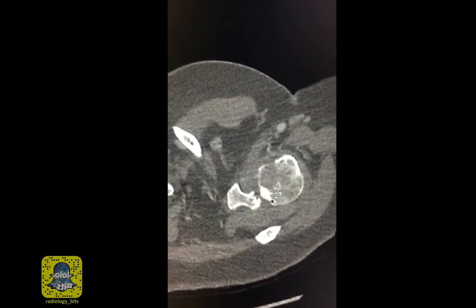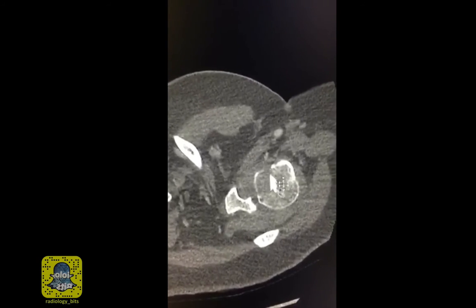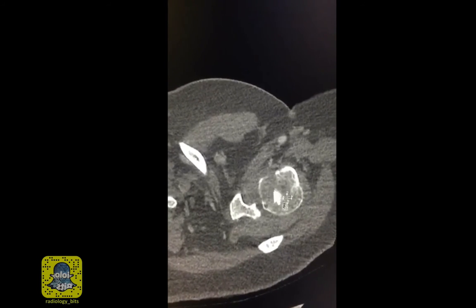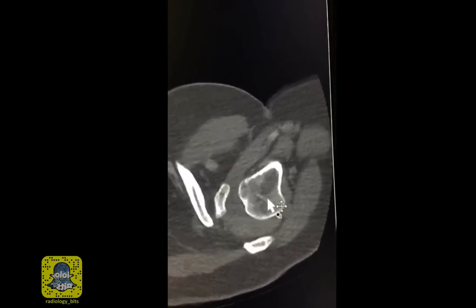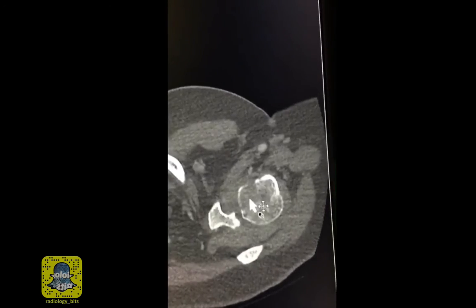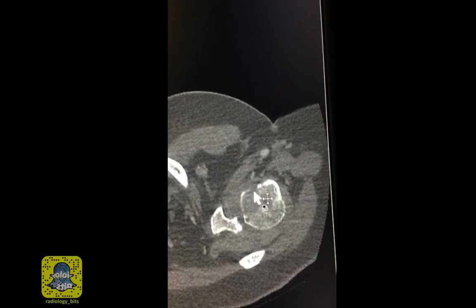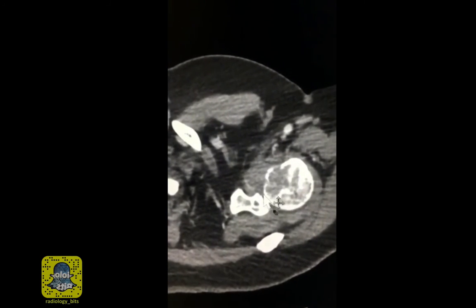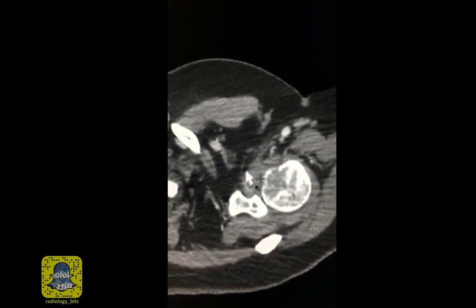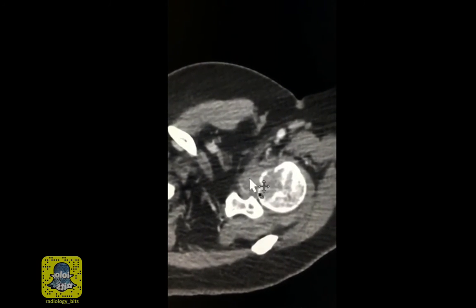Let's not forget to look at the bones on the CT chest, and here you see the lesion that was clearly detected on the MRI. There's a very heterogeneous appearance of the proximal humerus, and the soft tissue abnormality involving the proximal humeral head leads to cortical disruption as well. So this is the soft tissue mass involving the proximal humerus, and you'd wonder if the adjacent changes are either loculated fluid versus extension of the soft tissue mass itself.